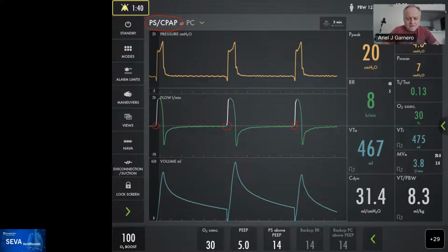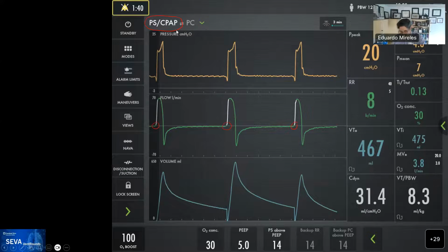All right, Ariel, for the sake of time, let's just finish this. In general, the overall message for the team is that we are still learning what early trigger or reverse trigger is, how it's formed, and where the problems come from. There is one mechanism that has to do with entrainment of the respiratory rate, in which the respiratory center signal starts matching the respiratory rate from the ventilator and follows that pathway.